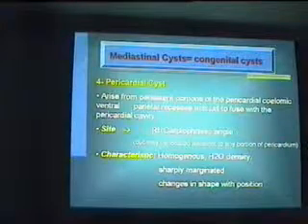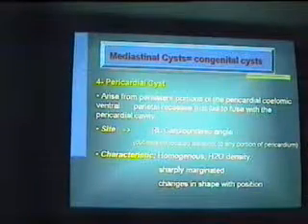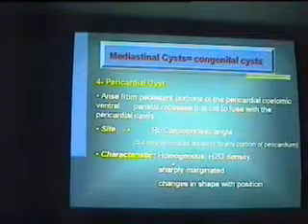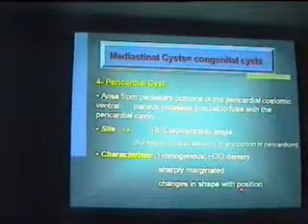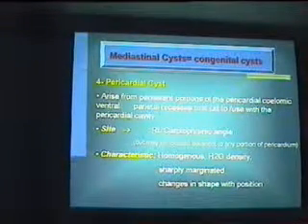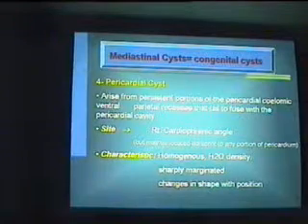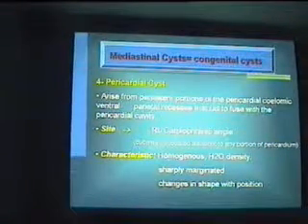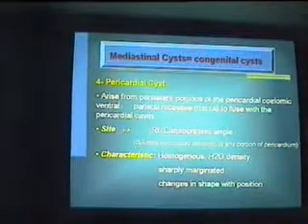اوكي؟ الكاركترز بتاعتها ايه؟ هي سيست فبالتالي هتبقى homogeneous of water density, sharply marginated or demarcated, changes in shape with position. لما العيان بيغير البوزيشن بتاعه عملنا له lateral من PA هيحصل تغيير شويه في الشكل because it is water يعني to be compressed easily with the nearby structures.